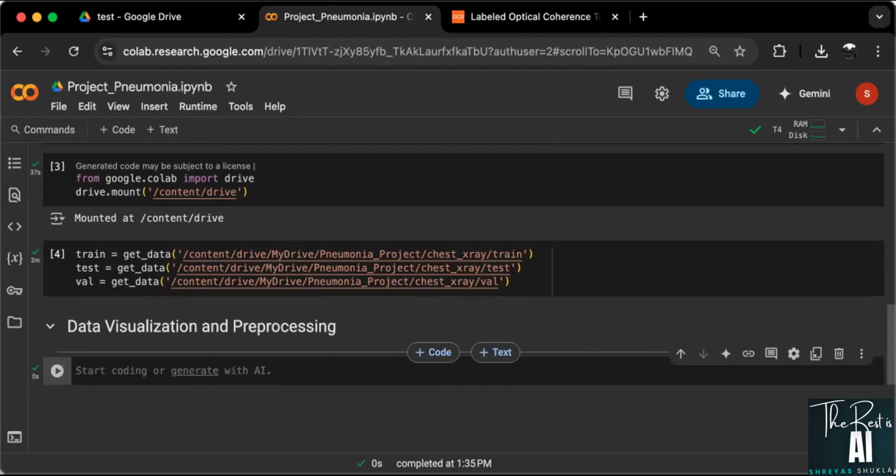And what I'm going to do is try to get an idea of whether my data set is actually imbalanced, because it is quite normal that people who are going to do the X-ray of themselves are suspicious of the fact that they are having pneumonia.